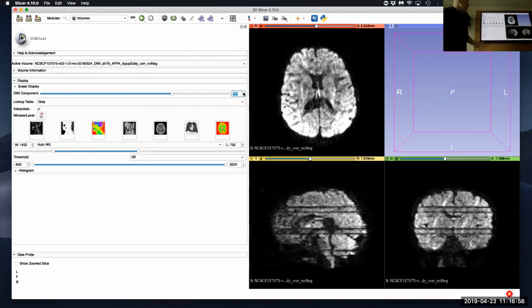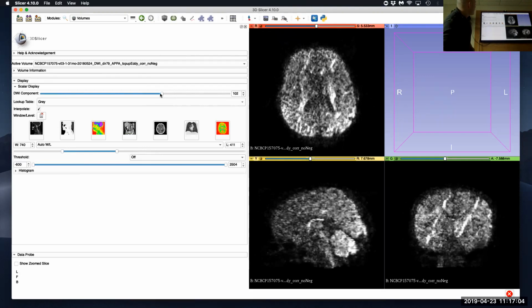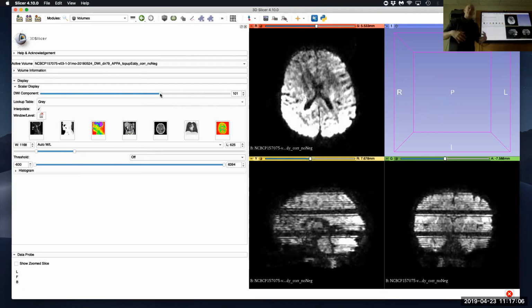And so you have to keep in mind, particularly if I go back to 101, if you enable interpolation in FSL, it will try to detect the bad slices and then interpolate that data. Even on the slices that are not detected as bad, there's so much happening that probably you shouldn't use those slices.